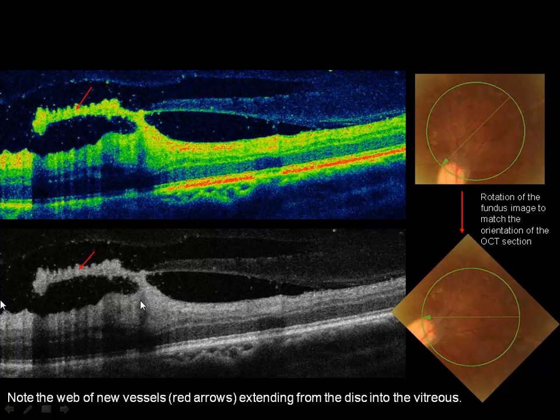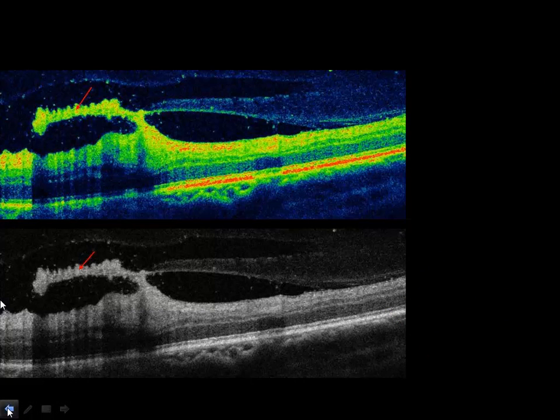And this is really proliferative retinopathy. So new blood vessels growing off the surface of the retina, off the surface of the optic nerve into the vitreous. So it's really like fibroproliferative retinopathy. This is not a diabetic. This patient has a fairly unusual condition. Diabetics can also present this way in almost a similar fashion.